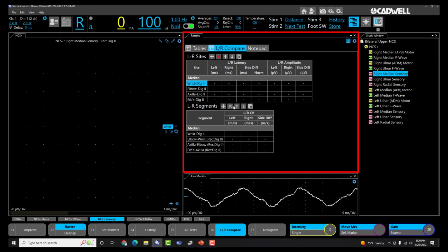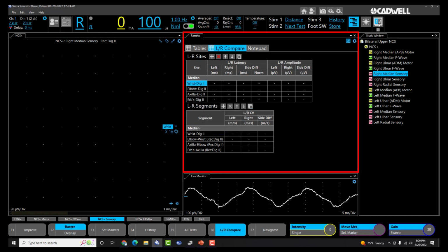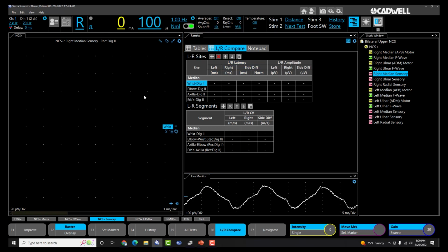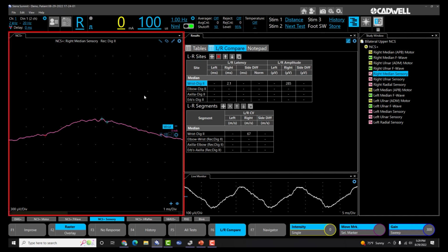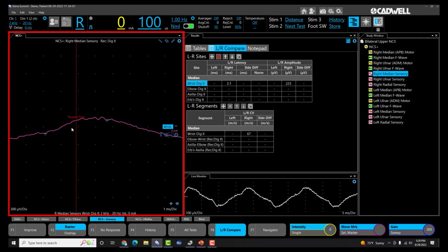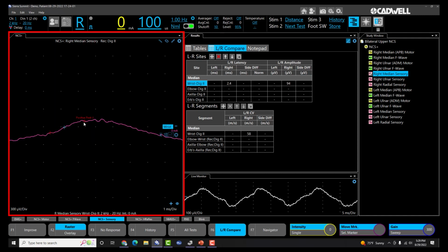That way we don't have to redo that again in both views. If you don't use view 2, it doesn't really matter. I usually like to keep them both the same though, just so that there's no confusion. At this point, it's always good to go ahead and test your parameter. So just stimulate something and get a result on there, so you can make sure all the right numbers are showing up. When you change cursors, make sure the right numbers are registering the cursor change.